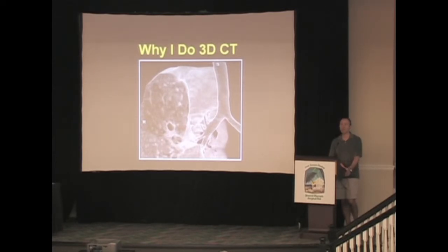So I got a call from the pulmonologist at Children's Hospital in Boston, and he said, "Do you think you could do one of your 3D CT images?" Well, lo and behold, we did it, and we found some very interesting results, which were that as you go down, she does not have a traditional right upper lobe bronchus, and rather she has her 3 segmental bronchi all arising from the right main bronchus. We also discovered that the only segment that had bronchiectasis was her anterior segment. So they were able to change the surgery from a lobectomy to a segmentectomy, and she's done very well.